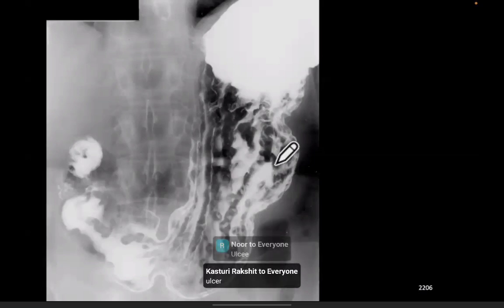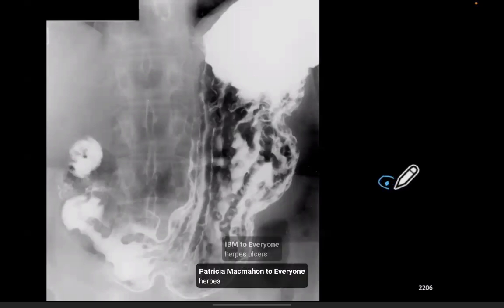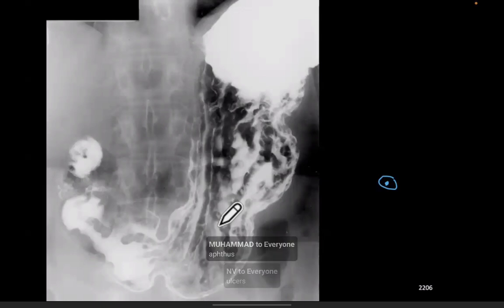Okay, what have we got here? Gastric mucosa on a barium meal. Got target lesions, okay? So in other words, a central dot and a lucency around that dot. There's one, there's another, there's another. So called bullseye or target lesions.